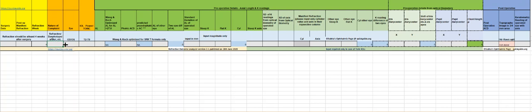You can put in the nature of complaints, the eye operated, and the IOL power and the toric model if it is applicable. But what I wanted to show you, the most important part, is where this tool actually helps you to validate your biometry data, whether you want to do it post-operatively, if there has been a surprise, you can go back to your biometry data to validate it, or you can do it not waiting for a post-operative surprise to happen. You can do it even before, when you are doing the biometric calculation pre-operatively.